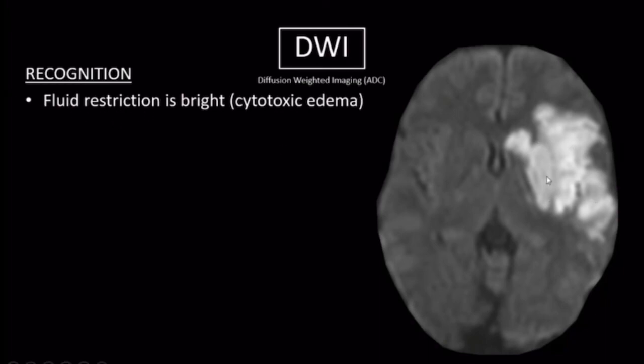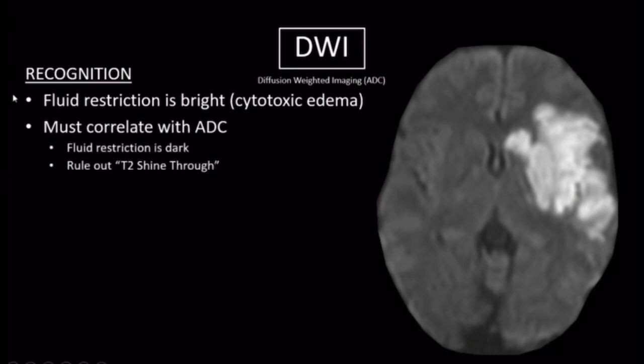So when we see an image like this, what we would say is we have an area of hyperintensity, which is indicative of fluid restriction, secondary to cytotoxic edema, secondary to a likely ischemic stroke. Very important, you must correlate these findings with ADC. And ADC stands for apparent diffusion coefficient.